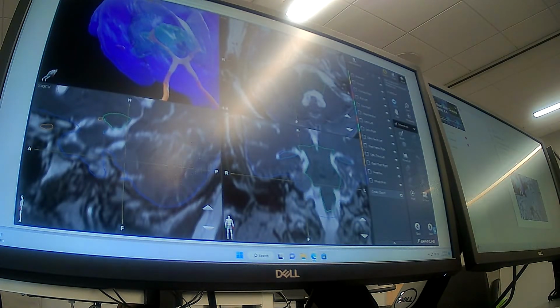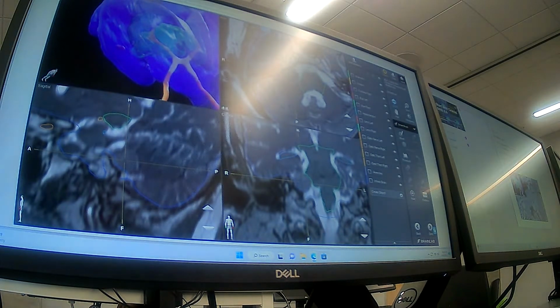I think you could just have them, or, I had to do it now. There's, oh, I have an anatomy button. Put it in the, where? At the top? This here? Left. I had you for a little bit. Yeah, I mean, I think that's what I was trying to do, because you went up and grabbed an attribute, right? Yeah, that's fine. Okay. Because I think what you were doing is that you were going to create an object, and then you have to contour it yourself.